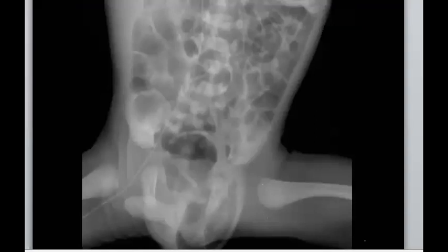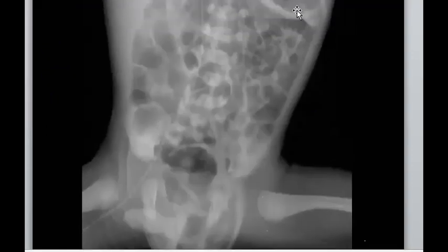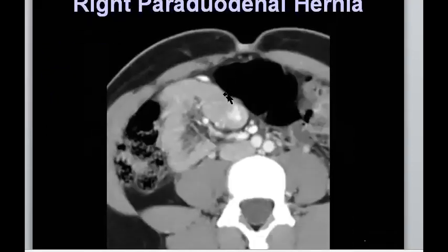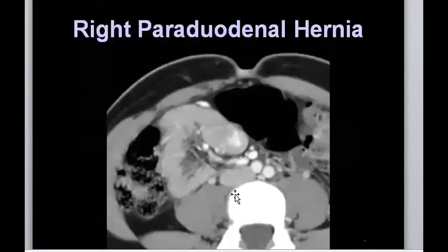When you find a pediatric case, search for the pediatric age group complications or diseases. And one of the most important things you may find is an inguinal hernia. Sometimes they show you that there is obstruction up, and they wait for you to see the hernial orifices.